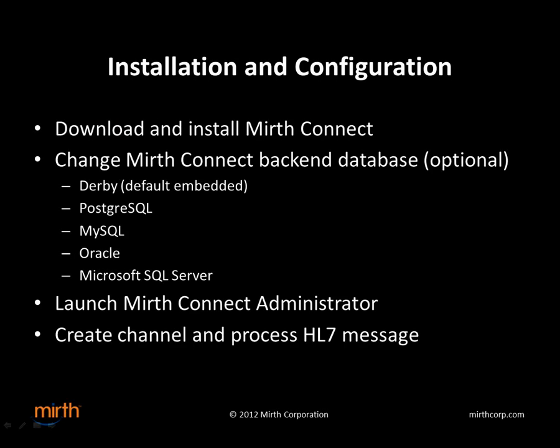Now I'm going to show you the simple installation and configuration of Mirth Connect. First, I'm going to download and install Mirth Connect. Then I'm going to change the Mirth Connect backend database. This is an optional step.